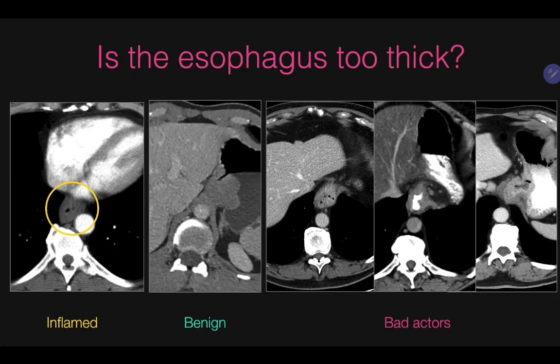Benign lesions, such as leiomyoma, can overlap with cancer, but are usually smoother, submucosal, and occur in a younger age group. And of course, you have to be careful about cancer. It can look like hiatal hernia, as in this first example. Oral contrast helps us to be more confident in this second example, which replaces air around the tumor that might otherwise look like rugal folds from a hiatal hernia.